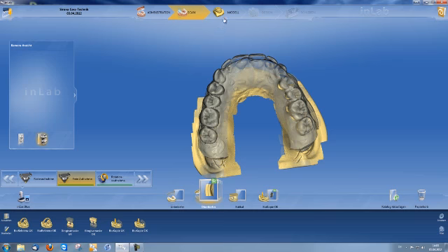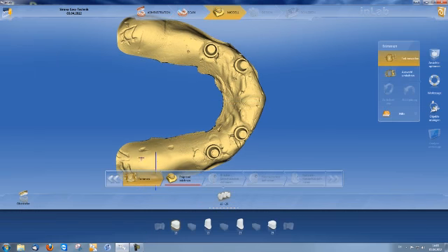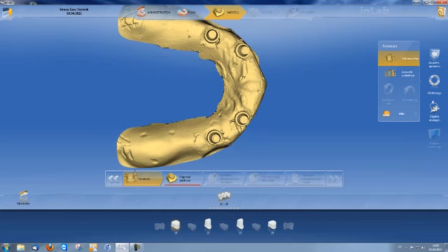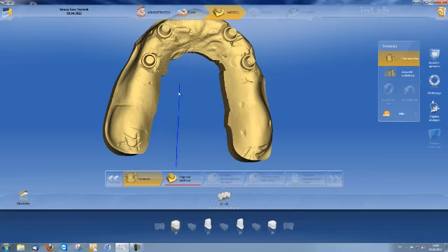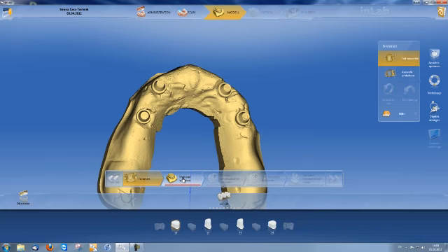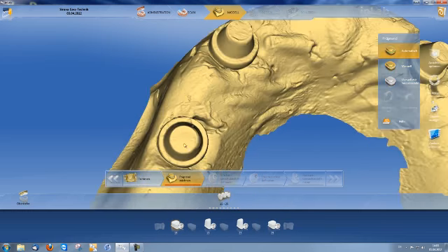We then enter the model mode, where I am able to trim my restoration again should I so desire. This is not expedient in this case. I jump immediately to drawing the preparation, and can now draw the preparation for tooth 15.